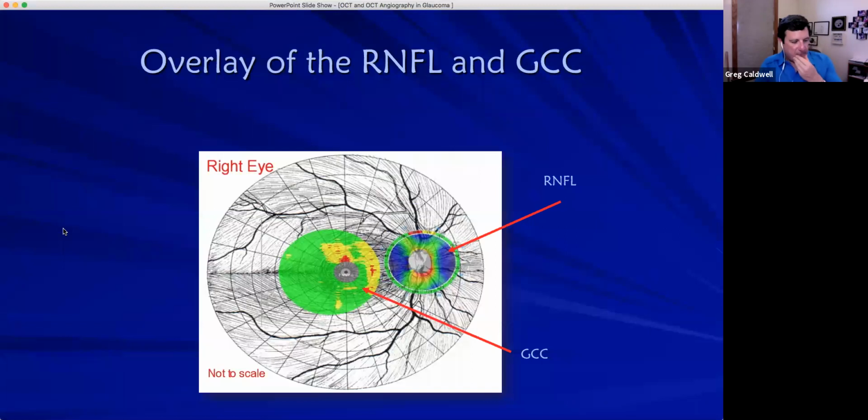So that's really all I had for anterior segment and using the anterior segment part of the OCT for glaucoma. We'll jump in and do a little bit of retinal nerve fiber layer and ganglion cell. And just a reminder, when you're looking at the ganglion cell complex and the retinal nerve fiber layer, remember if there's a defect superior temporally, that's the glaucoma prone zones, as you hear Dr. Salka and I talk about. Superior temporal, inferior temporal. That's where we want to look a lot of times on OCTs. Glaucoma is really not nasal or temporal. It's that superior temporal, inferior temporal region.